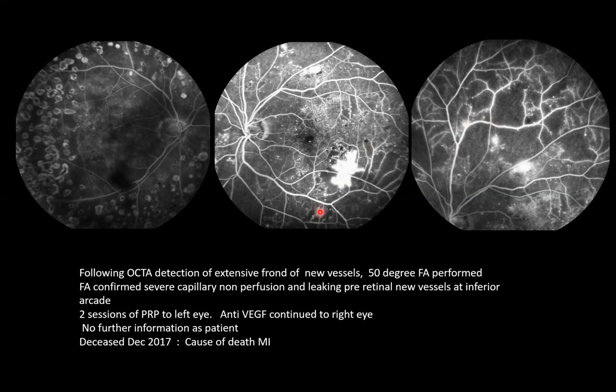And unfortunately, this patient passed away in a myocardial infarct not long after the start of anti-VEGF treatment and the finishing of the PRP, pretty much confirming that he was a vascular patient right from the beginning.